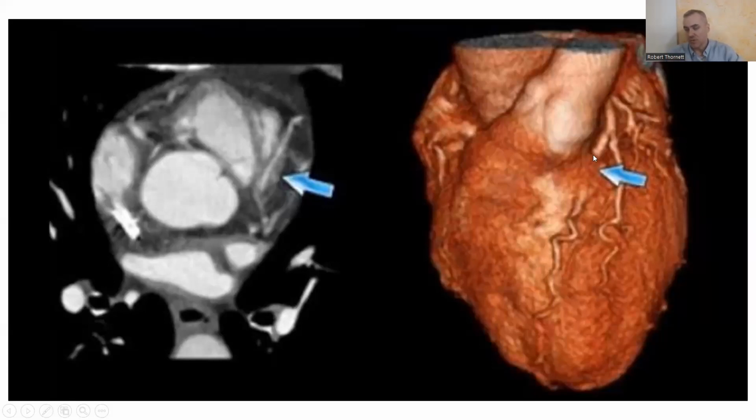That tells you it's probably pretty deep, because if it was superficial, it would only be a very thin band of muscle on top, and you'd still see the relief or the elevation of the artery, but you see nothing here. You just see the surface of the heart. So whatever your myocardial bridge is, whether yours is mid, you'll see the artery kind of disappear in here, or fade out in there, or at the bottom, or wherever yours might be. You just want to look for that.